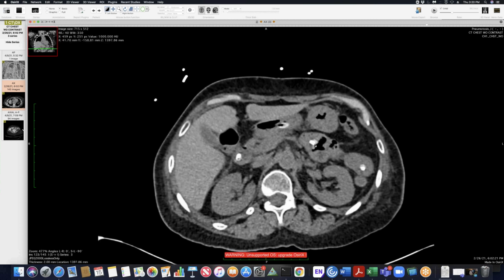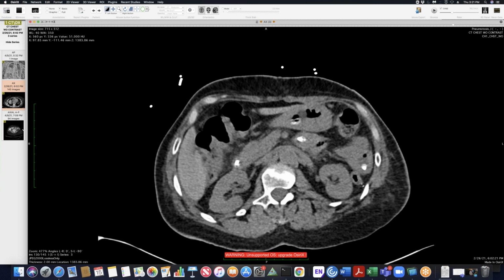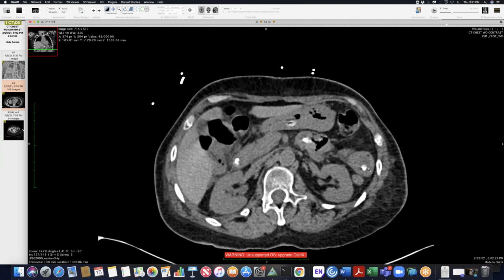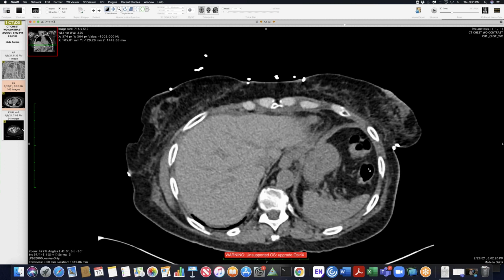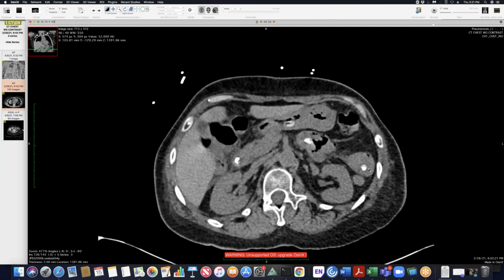Yeah. Because I checked their op report and it said we think it's CellCept, and then I Googled and there's some reports of that. And then I went back, and it had been going on for about a month, looking back at prior radiographs, or even longer, but the furthest back I could trace it was this chest CT. You can notice some very subtle changes in the walls here. You can see some little gas pockets developing there. I don't think this is diverticulosis, as I was looking at it in other planes too, but there are some other little pockets. So this is from February 26th.